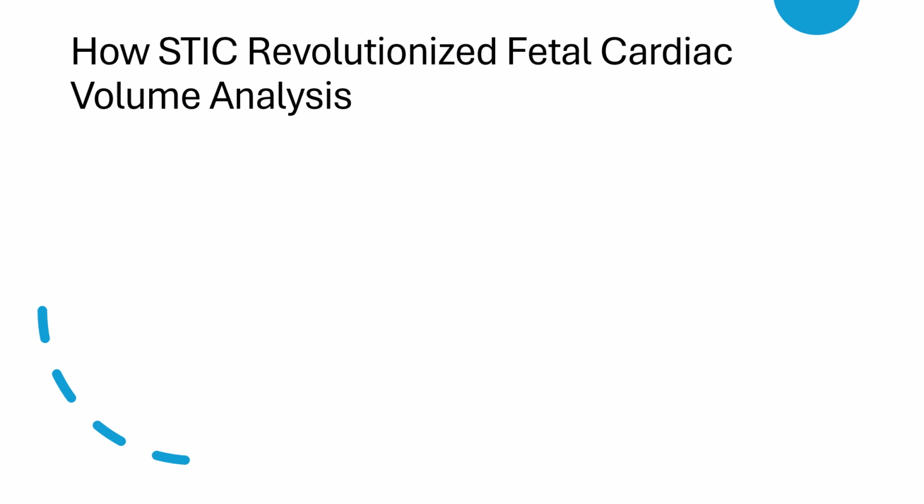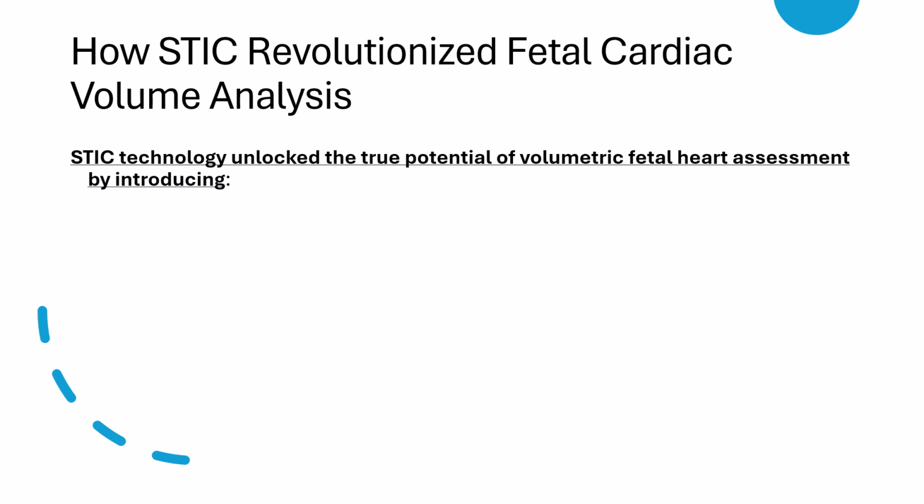STIC technology has fundamentally transformed how we assess the fetal heart by overcoming several critical limitations in traditional 4D imaging. Let's break down how this innovation works. First, we have a virtual cardiac gating.